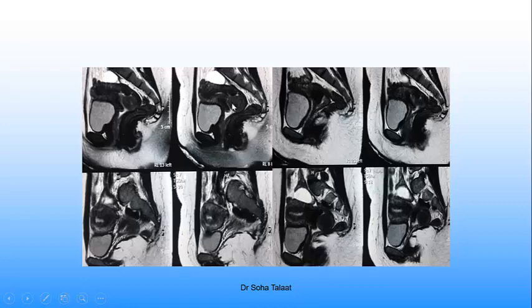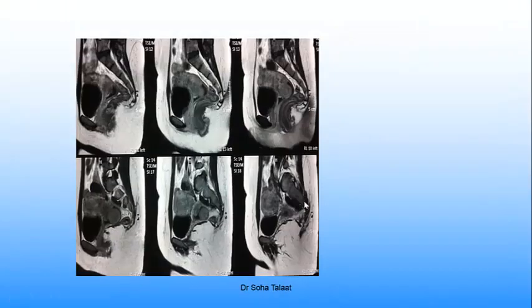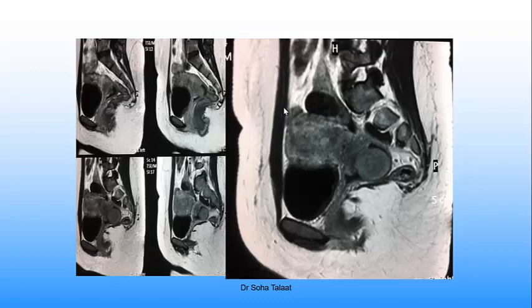It has a pedicle coming from the anterior myometrium, and then here note the signal intensity. It is hypo or iso-intense to the myometrium. It is hypo-intense on T2 with fibrous tumors, so this is a fibroid. Also, the patient has accidentally adenomyosis, and usually adenomyosis and endometriosis are associated with fibroid lesions, and she has a cyst in the ovary also here. But this is the signal intensity of a prolapsed fibroid. It takes the same enhancement as the myometrium, so this is a pedunculated prolapsed fibroid.